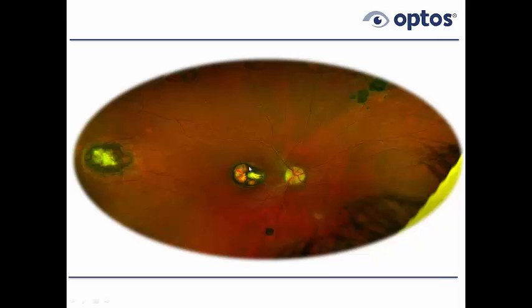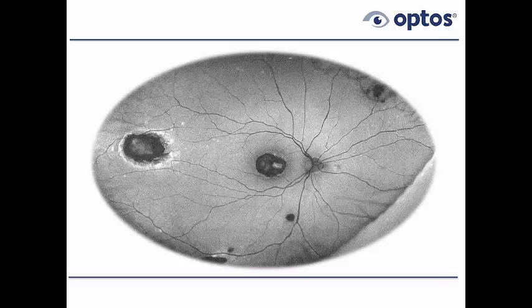In any case, the acuity is gone because the macula is wiped out with this congenital lesion, but there are a lot of satellite lesions, which occur often in congenital toxo. Here's the autofluorescence of this, the ultra-wide field autofluorescent images. And all the way out here temporally we can see we have a dark zone, but it has a bright border around it, suggesting that this actually may be active. And that we get concerned about.